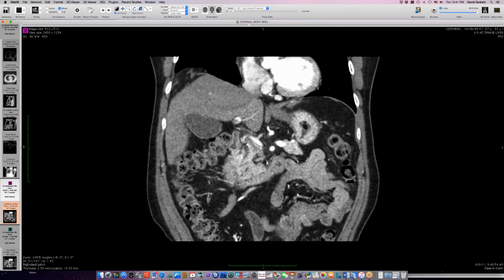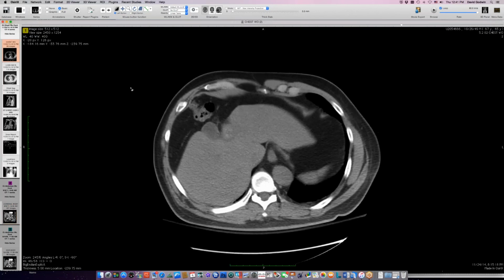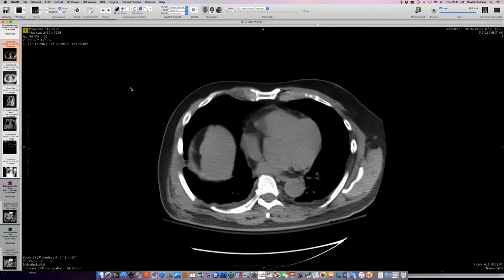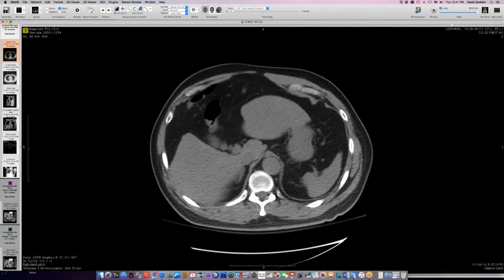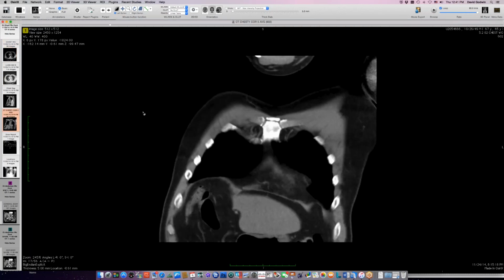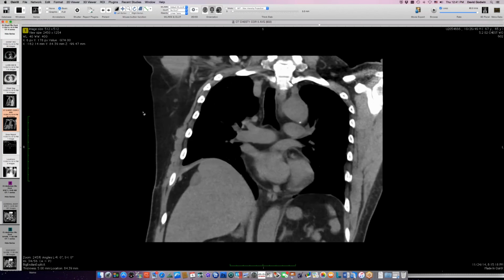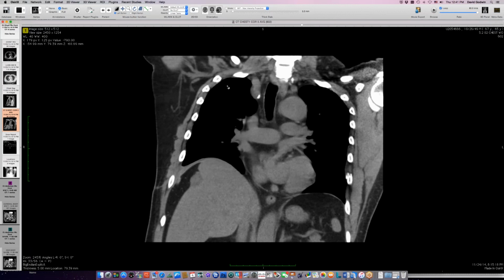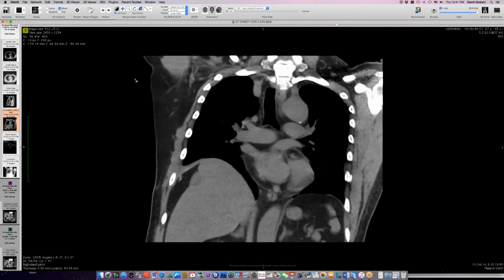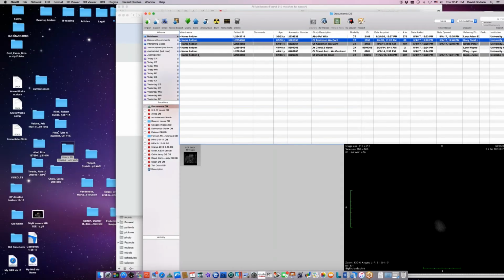And then eventually, I think there was even some liver going up through that. So this is cross section, but do we have liver getting through it? Said to have liver. Let's see. Or this is actually, I'm sorry, this is after the repair, so I didn't include the lesion that showed increased herniation of stuff through this right hemidiaphragm. So does that case qualify? Yes. Yeah. Okay. Yeah, very good. I think there's one more here. Let me see.